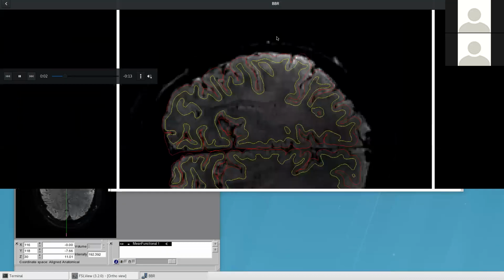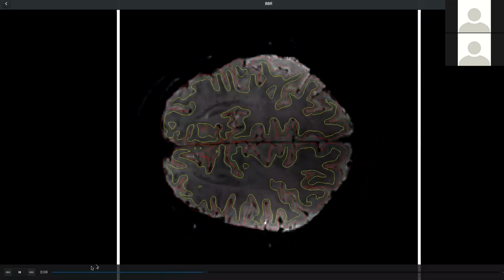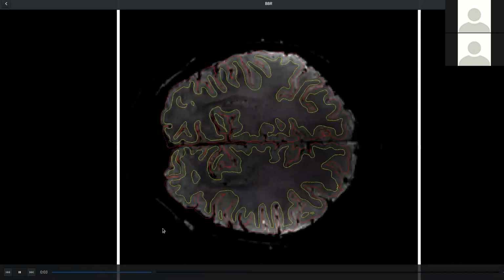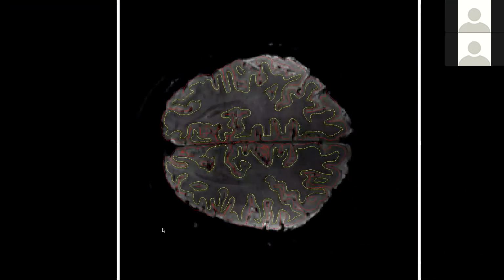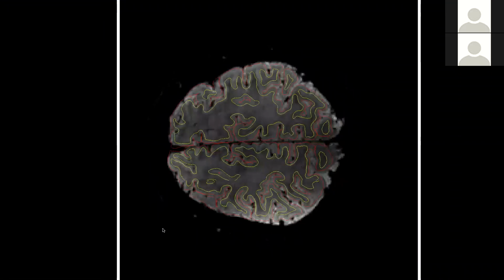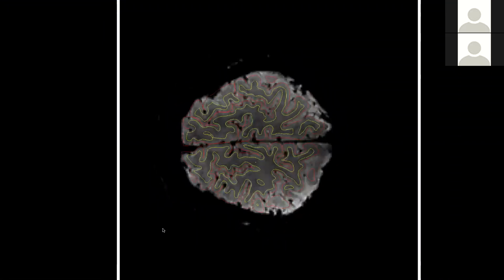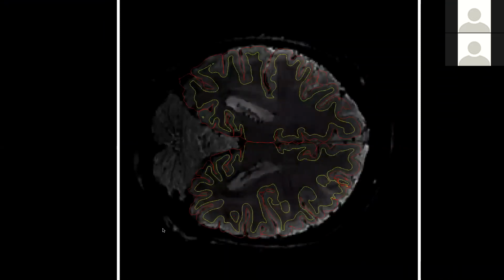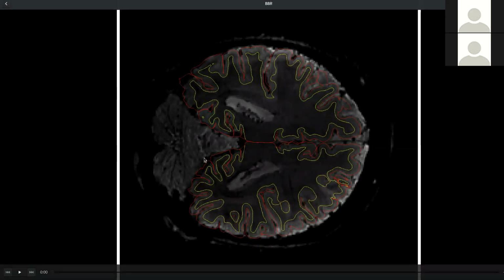And what you'll see is this little file. The take-home message, oh, sorry. Let me start that from the beginning. So that's just a file of the functional scan with the FreeSurfer boundaries on top of that. And you could, if you want to, run another co-registration step, or like this recursive boundary registration, for example, and output a similar file like this. The take-home message is it's very useful to have some intermediate quality control steps.